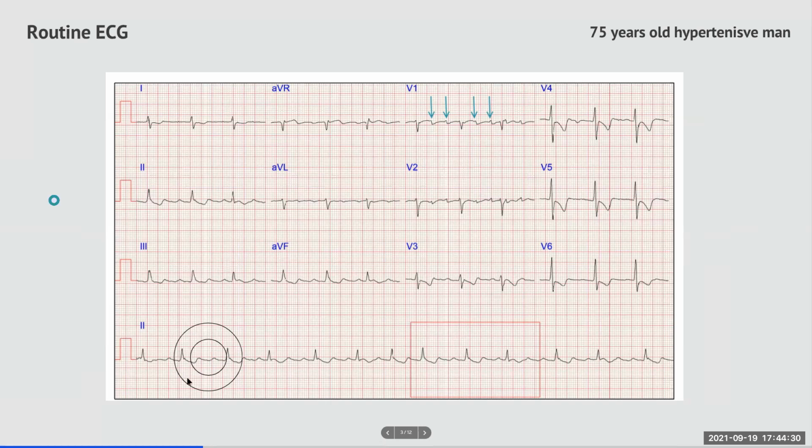So this is actually a very good ECG in which the rate is less than 100 beats per minute. But actually, this is atrial flutter. And that's why you see these T wave inversions in the inferior leads, in the lateral leads, and also the ST segment depressions here. So basically, this is not ischemia. This is actually atrial flutter. And looking at this sawtooth pattern, typical atrial flutter. Obviously, we can discuss at length typical and atypical flutters, but let's leave it at that.